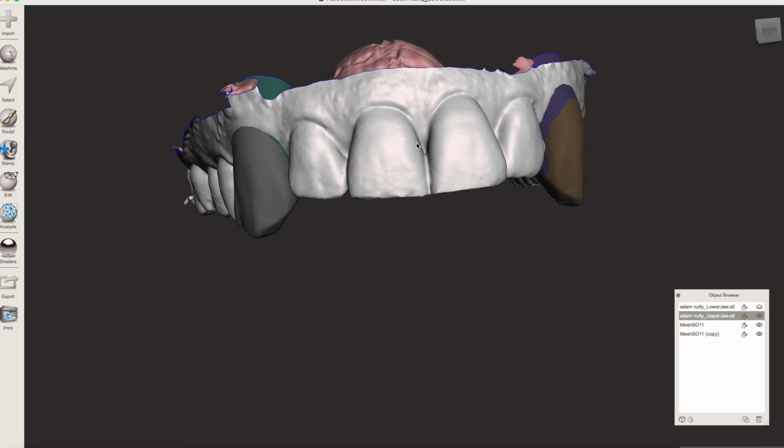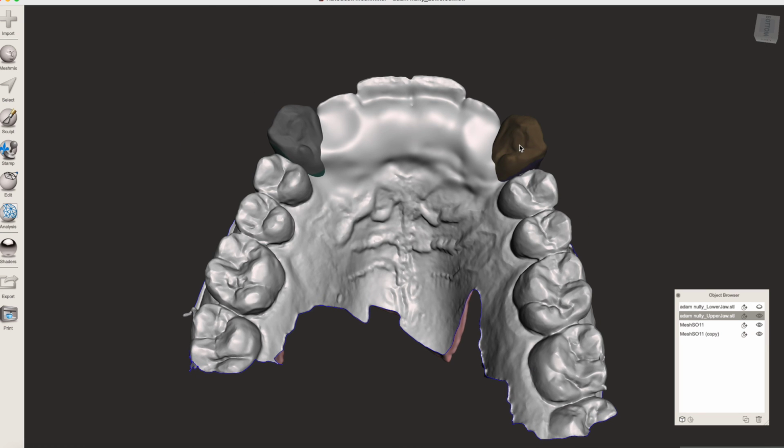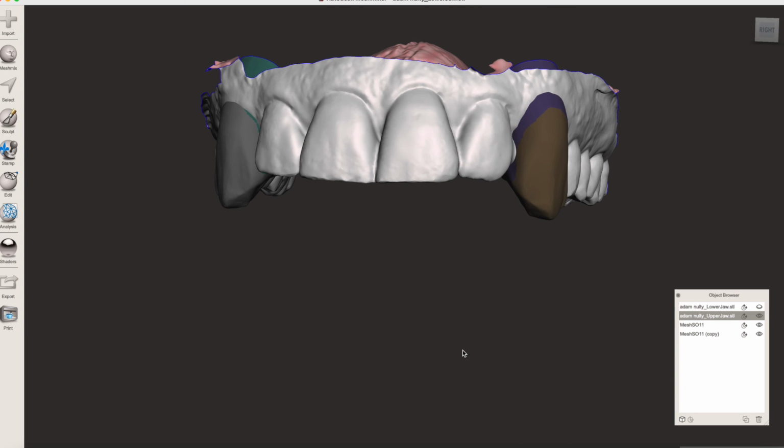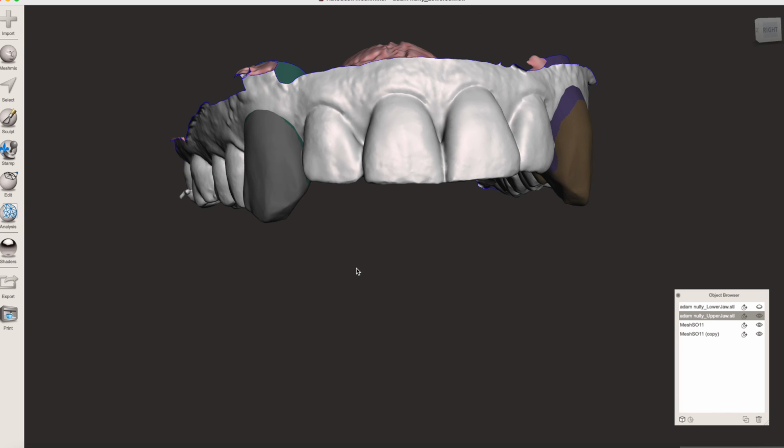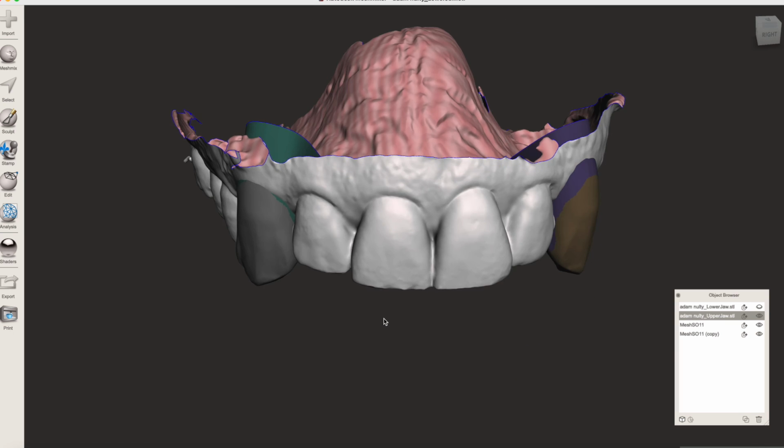This bite obviously is against the teeth. But now if we turn that into a model, we're going to have all this as extra. We take a putty impression. Once we've got that putty impression, just pop it over the top with some temporary acrylic, and you have vampire teeth with a big load of stuff here that you can hold in place on your palate.